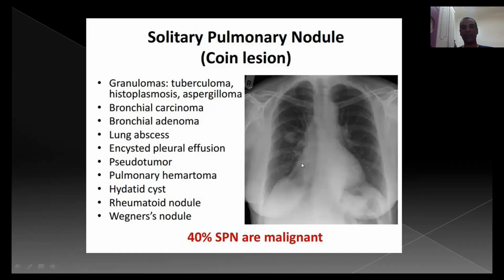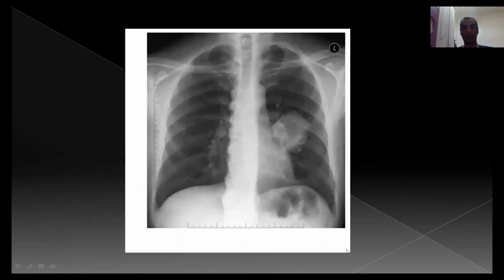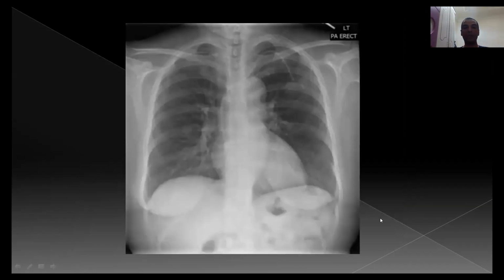So be careful, and you should search for this nodule. Look for this one; it's clearly identifiable. But sometimes this one is a large mass, a left parahilar mass, irregular in shape. Sometimes the pulmonary nodule is difficult to identify, so you should go with a checklist.